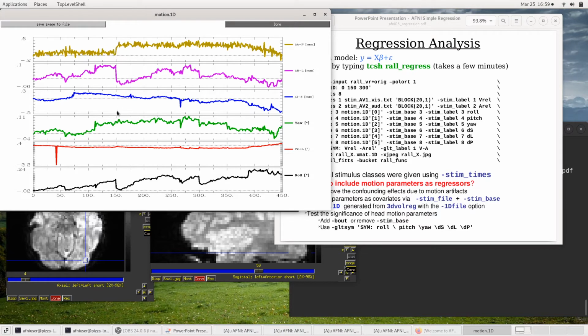We'll typically model the motion parameters separately per run. Anyway, so run 1, run 2, and run 3 here. There are some spikes in this. There's a spike down here, a spike over here. Remember, this is that 2-degree head rotation, a pitch.